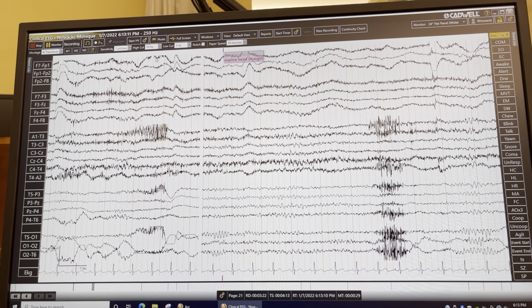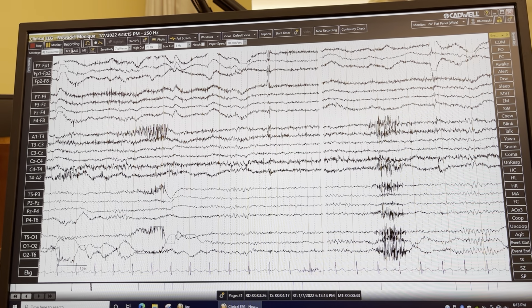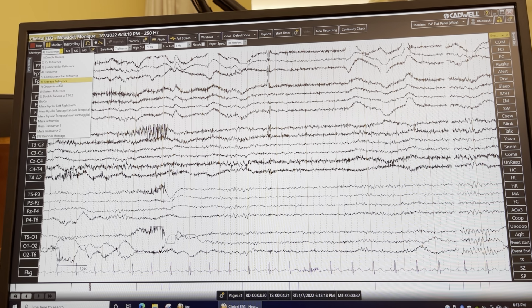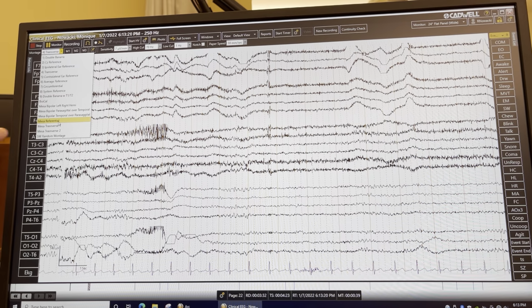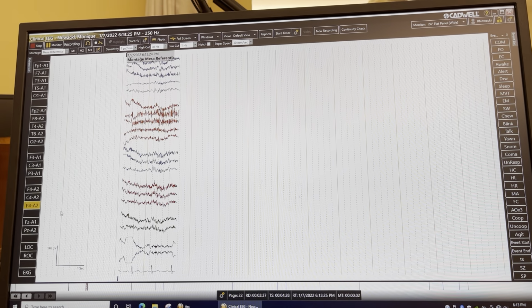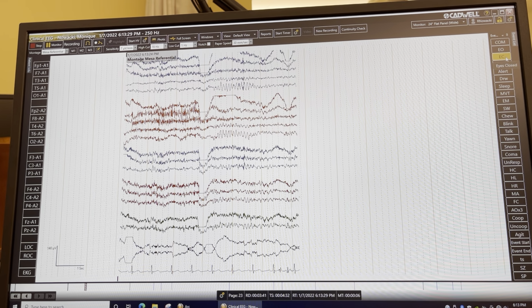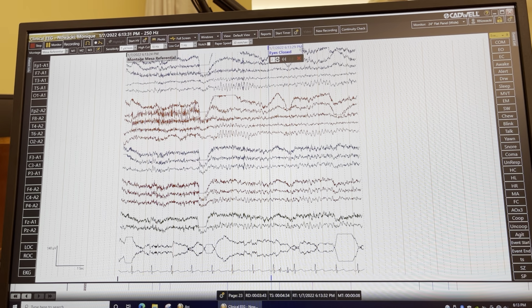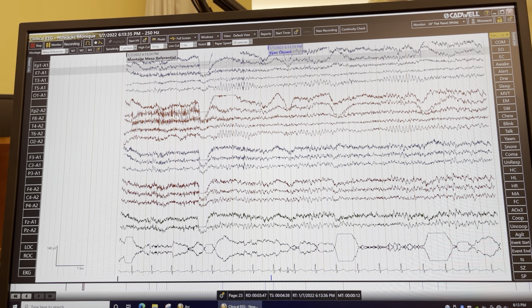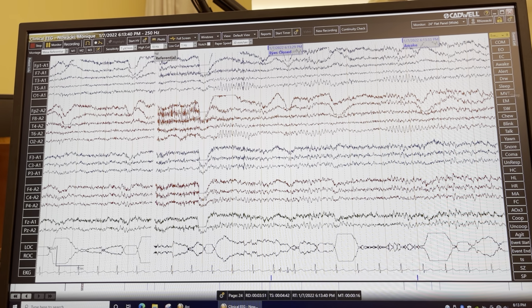Okay. So and then let's say I want to go to the referential, but I don't want to use my pre-program. So I click on the down one and I go Mesa referential right there, and then it turns into the Mesa referential. Again, I click on eyes closed, just drag it wherever I want it to, and then click on awake right there and drag it, and not drag it, just move the cursor and then press it again.